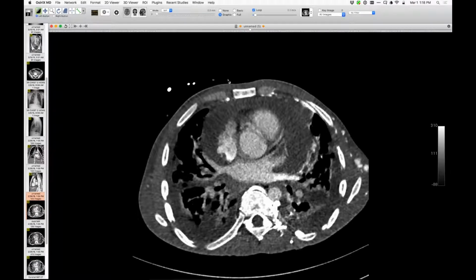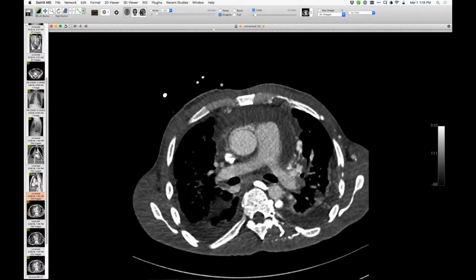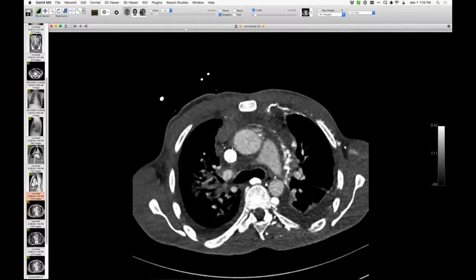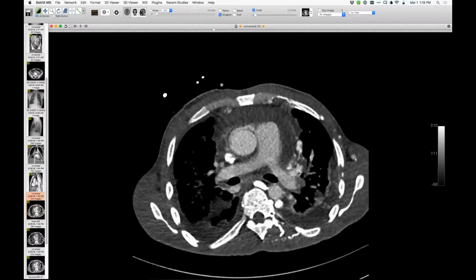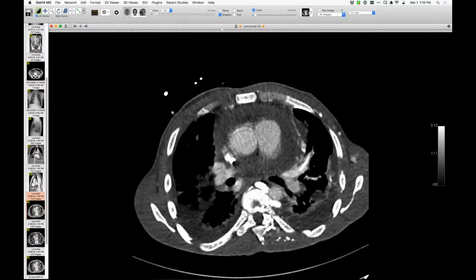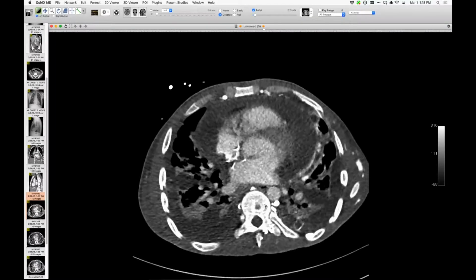Particularly the superficials, I won't show you all of them because we've all seen these before, but the ones I want to really show you today, which is really interesting, are the collateral pathways that go from systemic veins to the left atrium. So we've all shown quite a few cases of shunting from perihilar mediastinal veins to the left atrium, but we also know that you can shunt from chest wall veins to pulmonary veins to left atrium.